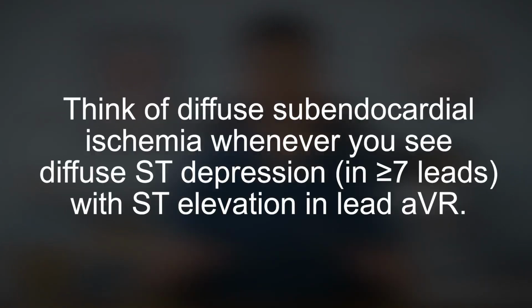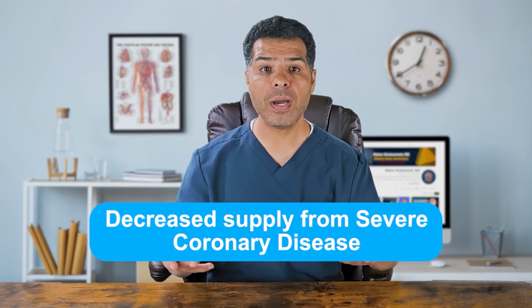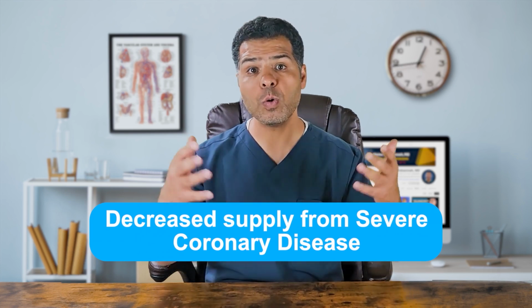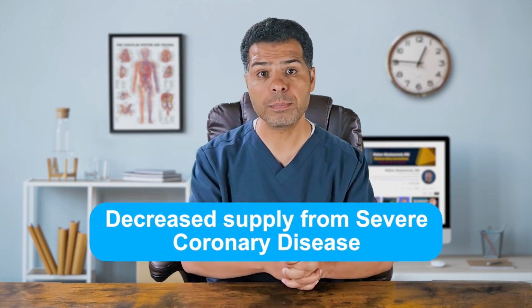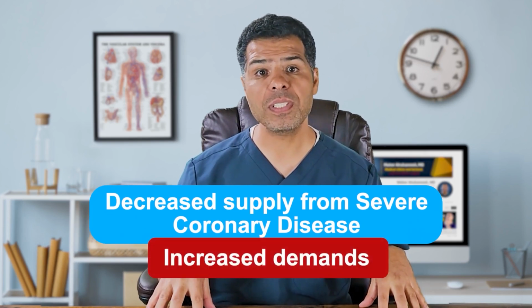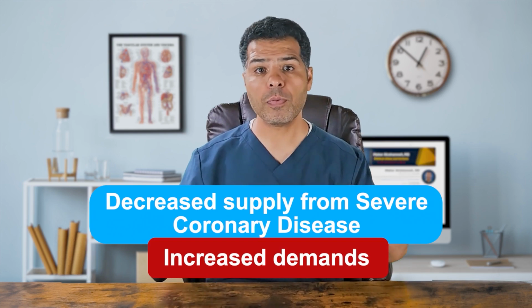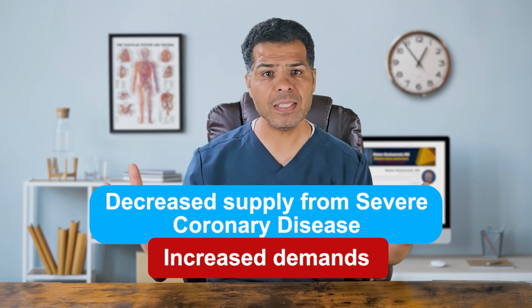Now, think of diffuse subendocardial ischemia whenever you see diffuse ST depression in 7 or more leads with ST elevation in lead aVR. Diffuse subendocardial ischemia can be due to decreased supply from severe coronary artery disease due to left main disease, proximal LAD, and/or severe 2 or 3 vessel disease, or from increased demands as we see in tachycardia, or from other arrhythmias, from shock, profound hypotension, GI bleeds, sepsis, etc.